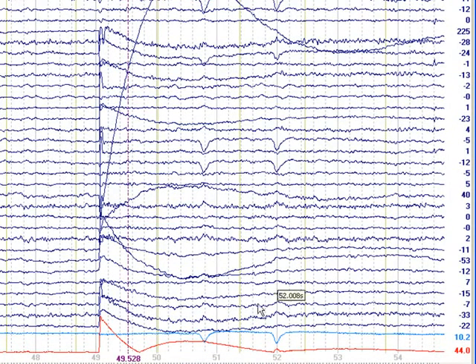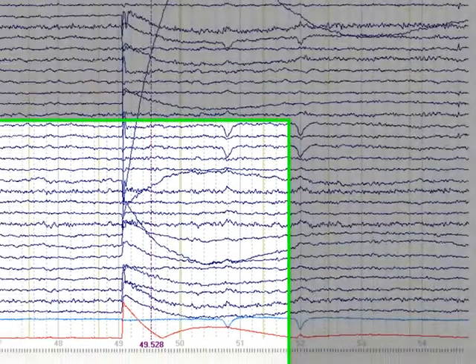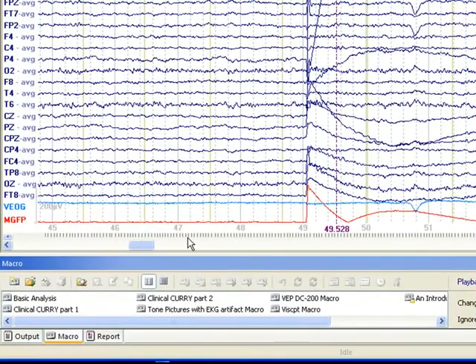Now, in this recording, if you look at the bottom, you see all of these hash marks. These indicate the presence of events throughout the data file, and we have type 1s and type 2s. The type 1s, think of this as a visual P300. So the type 1s are the oddballs, and type 2s are the frequently occurring events.